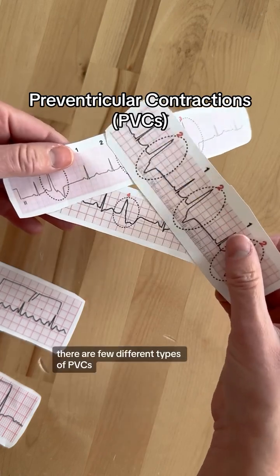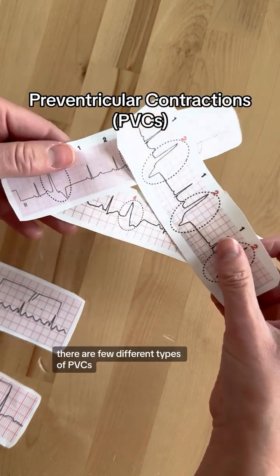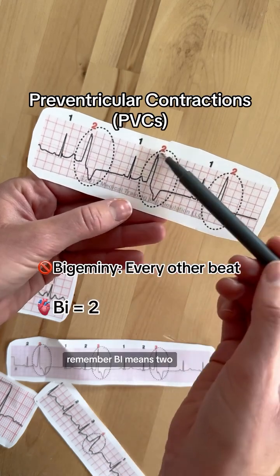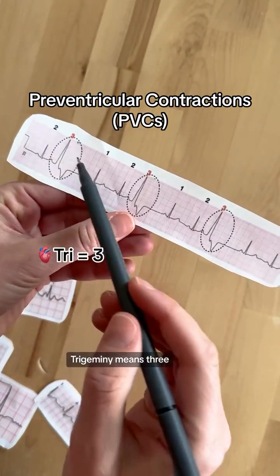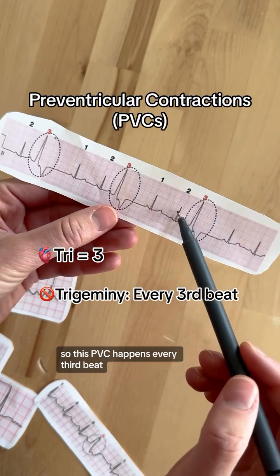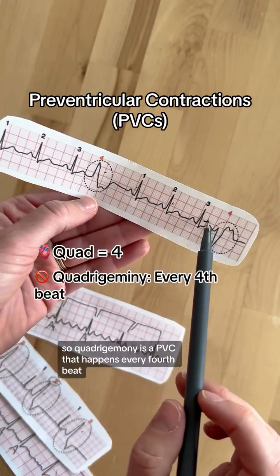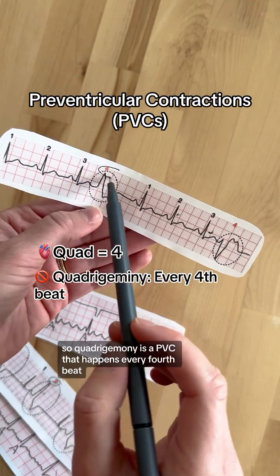It's important to note there are a few different types of PVCs. Bigeminy, which happens every other beat. Remember, bi means 2. Trigeminy means 3, so this PVC happens every third beat. Quad means 4, so quadrigeminy is a PVC that happens every fourth beat.